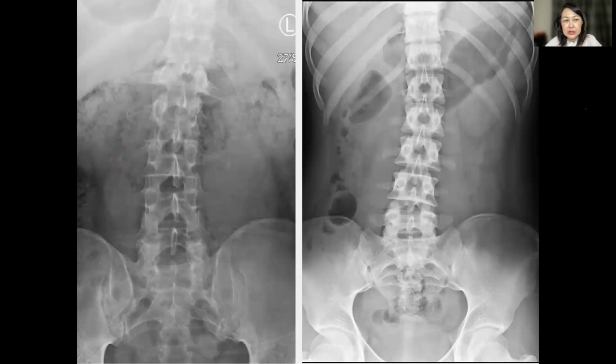Perforated gastric ulcer. The one I will show you as pneumoperitoneum, but not in this case. That one we will look at on the chest X-ray. So PGU, no. Diaphragmatic hernia? I will show you on the chest X-ray, but not the abdomen. It will herniate through the diaphragm and protrude into the chest. Impacted stool, no. Okay, so the answer is psoas.